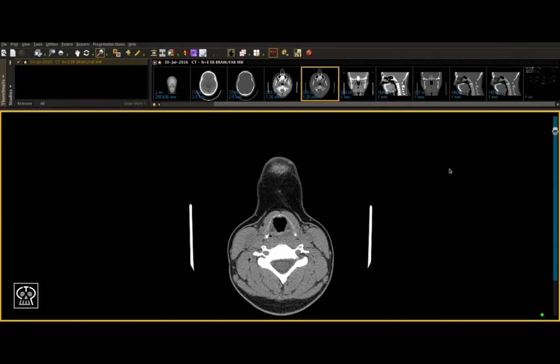The first area of the face we're going to look at is the mandible. The mandible is arguably the most important structure to identify properly on a CT facial bones, as it is the majority of fractures we see as oral and maxillofacial surgery residents. At McGill, we operate with a trauma team and cover full facial trauma, but at some institutions, mandibular trauma is the bread and butter of your rotation.